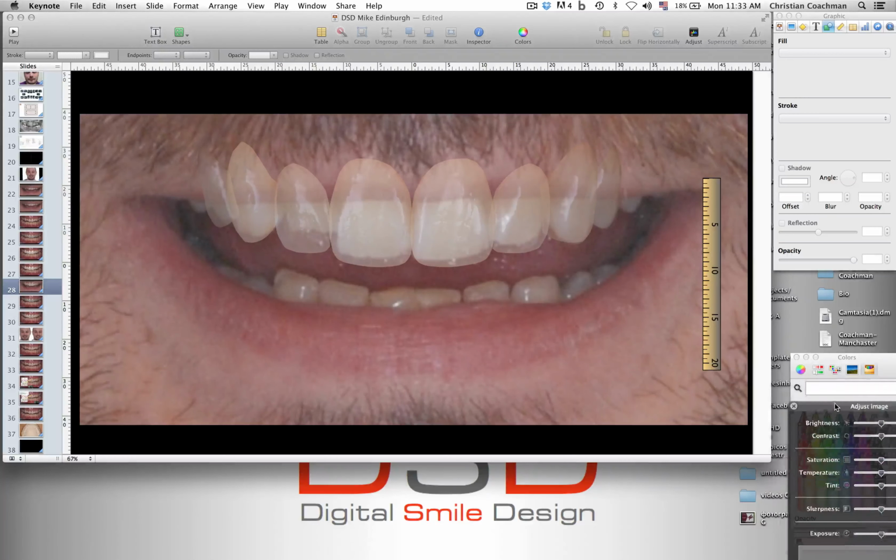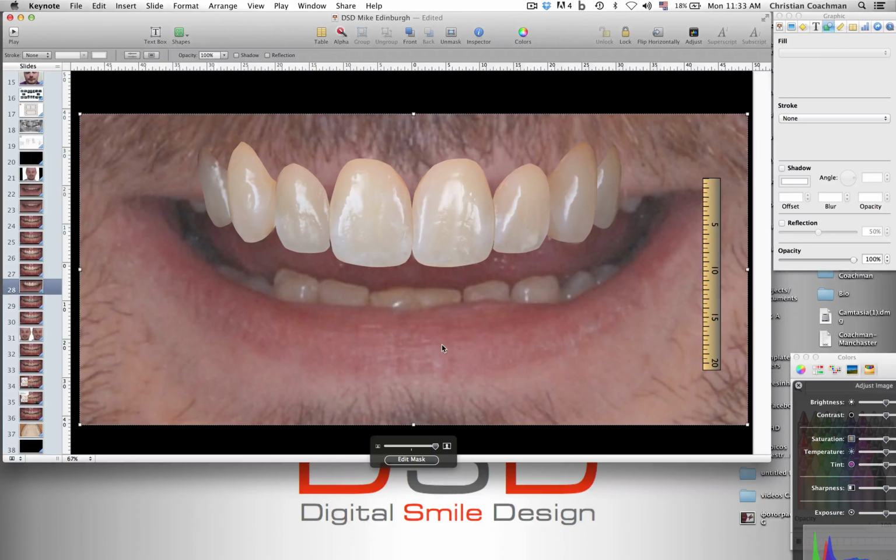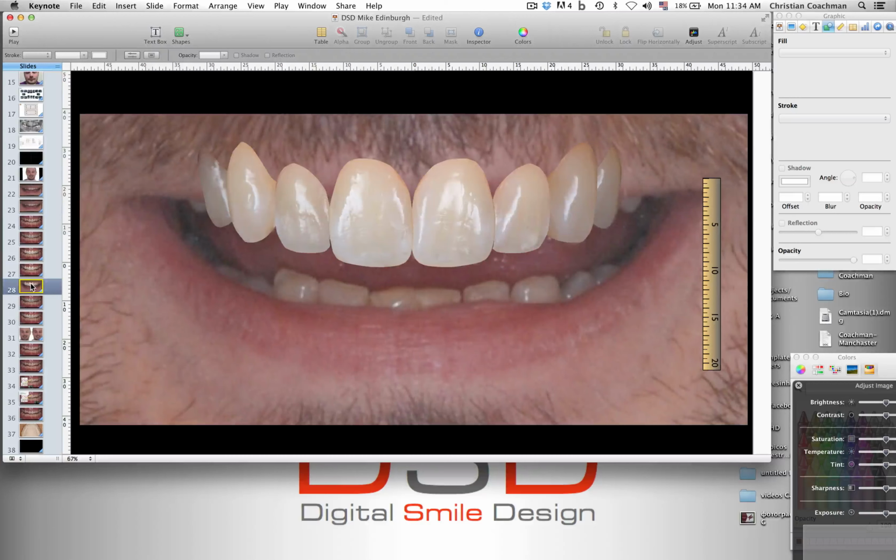Now the last step is to bring the lip in. But first I don't need this translucent anymore. I need the lip now. So the lip. So you selected the back photo. Okay. You come from here and you go back to here. If everything is overlapped, the images will overlap perfectly.